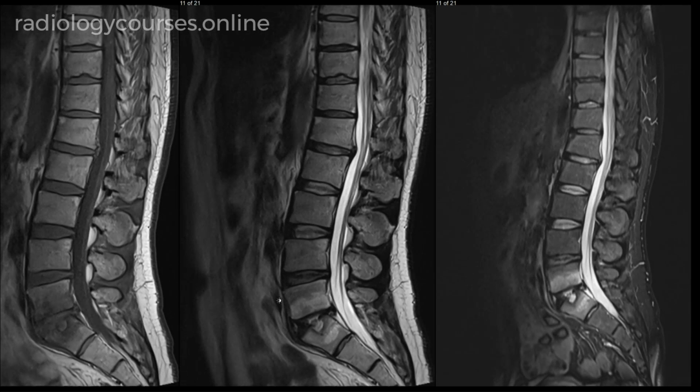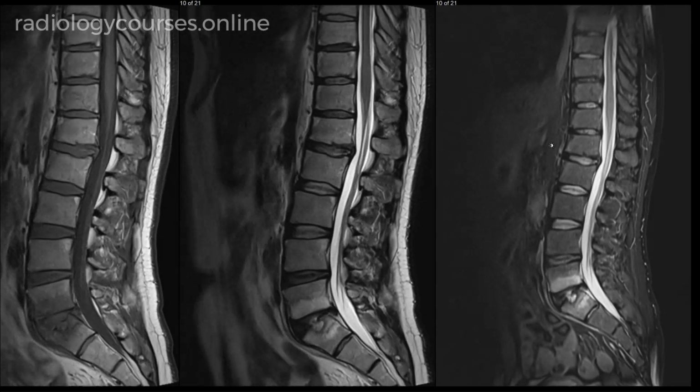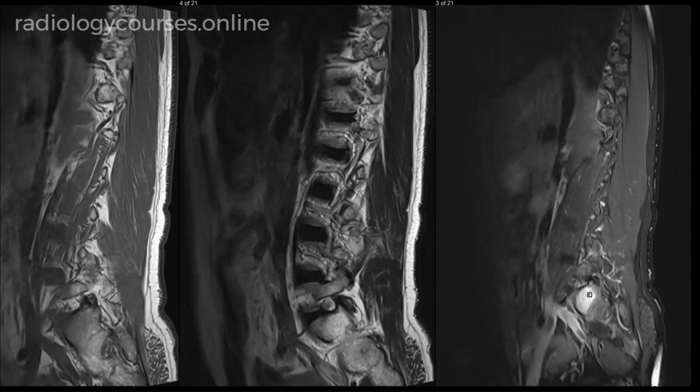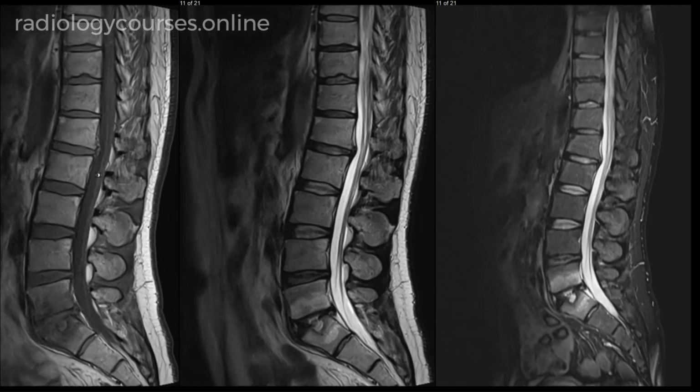In summary, I am showing this patient not to overdiagnose Modic type 1 as subclinical discitis, and also when we see Modic type 1 degenerative changes we should be looking carefully at the corners of the vertebral bodies on all sequences and also on the edges of the films to look for sacroiliac joint abnormality.